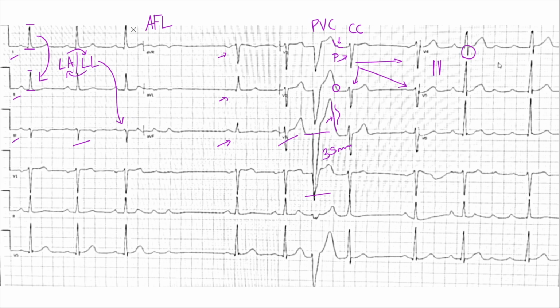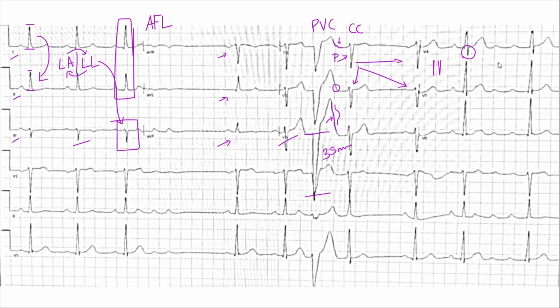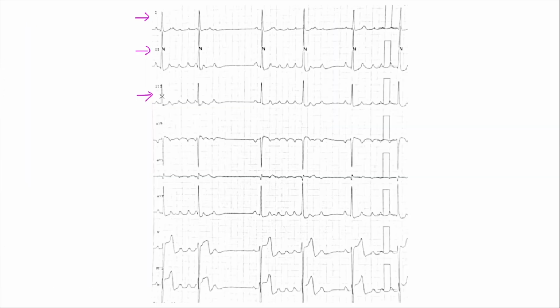Pay attention to lead 1, lead 2, and I really should have extended this down to lead 3, right? So look at this. Lead 1, lead 2, look how much taller it is, and lead 3. Look at lead 3. Here it's negative. It almost looks like a Q wave, right? Here it's completely positive.